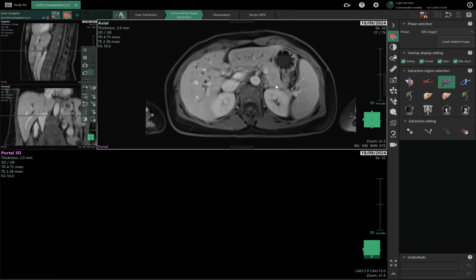From my point of view, if this is the only study you have, because sometimes the patients only have this study, or they bring a CD or whatever, and it's the only thing you have to struggle with and do everything by hand, manually. It's not the best use case, but it's the one you have.